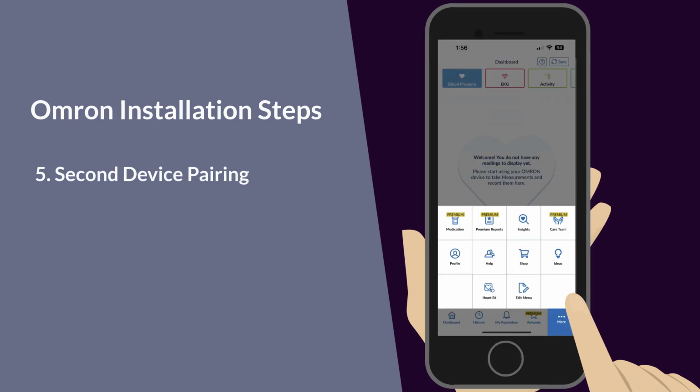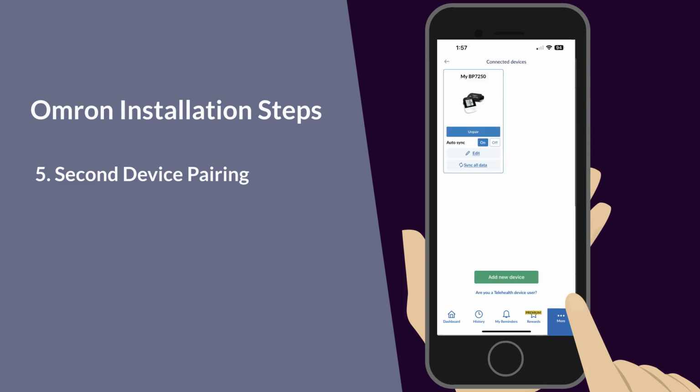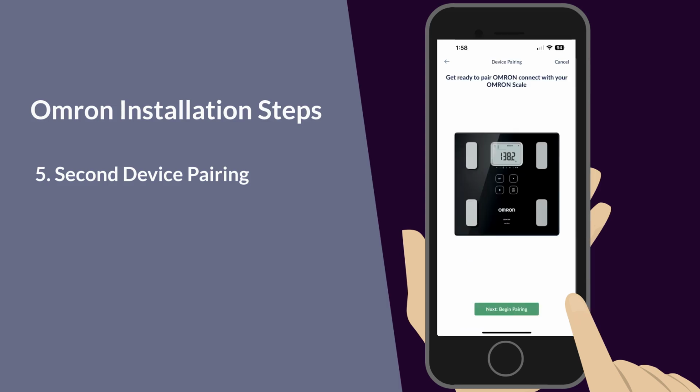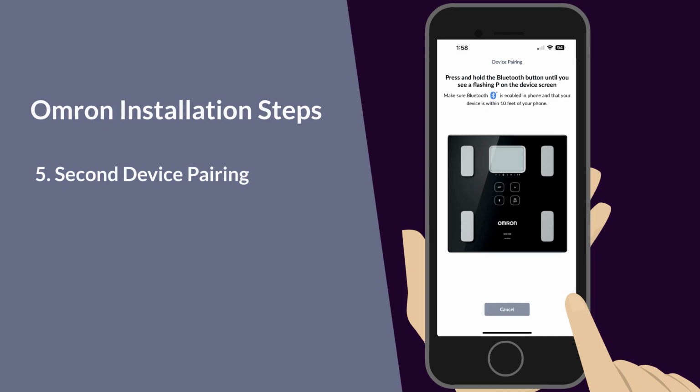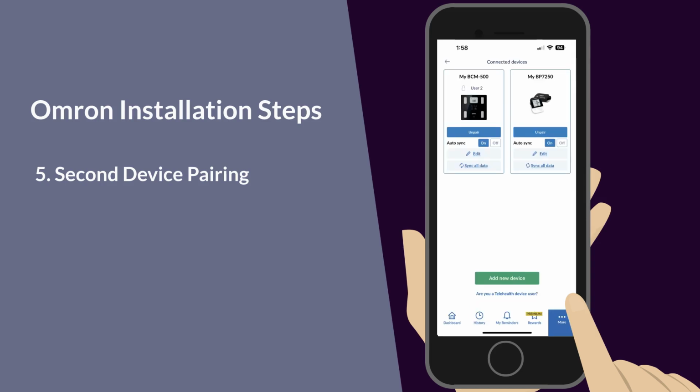If you need to add a new device or if you get disconnected, go to your profile and find the Connected Devices tab. Tap on it and then select the Add New Device button to choose the weight scale. Keep your weight scale near your phone. Tap Begin Pairing to start. On your weight scale, press and hold the Bluetooth button until you see a flashing P on the scale. Make sure Bluetooth is turned on in your phone settings, and your weight scale is within 10 feet of your phone. Your device is now connected. You will be able to see both of your devices in the Omron Connect app.